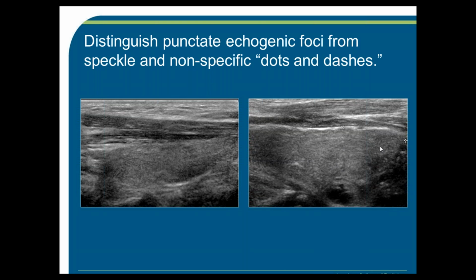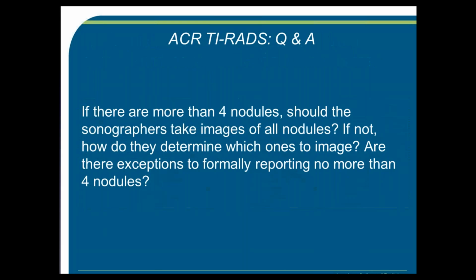So before calling them in a given nodule, I look at the adjacent parenchyma or the parenchyma elsewhere in the gland, and I make sure that they're really confined to the nodule and they're well-defined and rounded.